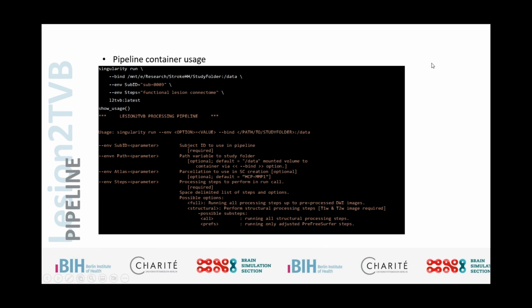The last step was the containerization, the last aspect for really enabling the reproducibility and the sharing of this. We created Docker and converted it to Singularity containers so that it can be run on high performance computing clusters and supercomputers. And the actual call is very, very simple because everything is done automatically and it assumes the BIDS standard. So typically in a container call, we're just mounting the data that we have into a data directory inside of our container. We define the subject ID, following pretty much the BIDS standard. So this is the study folder containing all of our subjects, and then via the subject ID we are selecting the corresponding directory, and then we're defining in just a string the different steps that we want to perform.